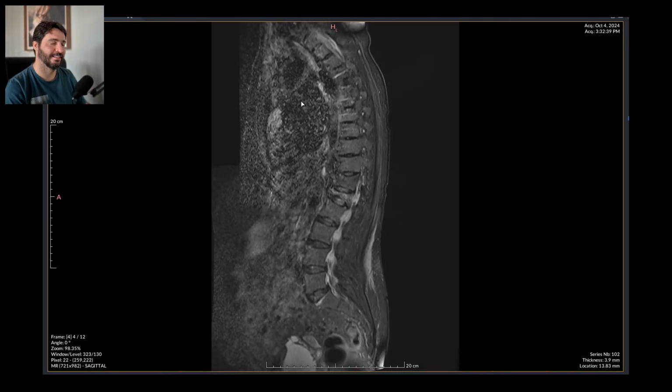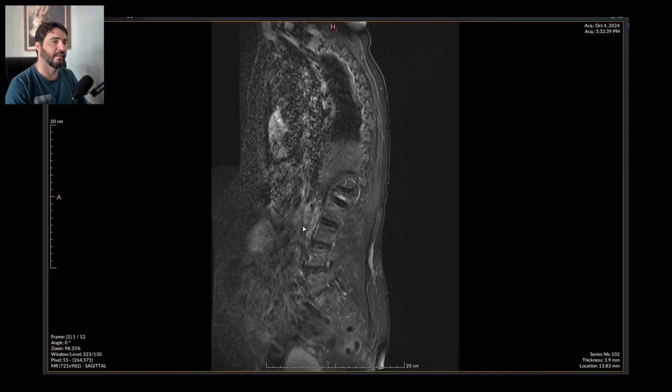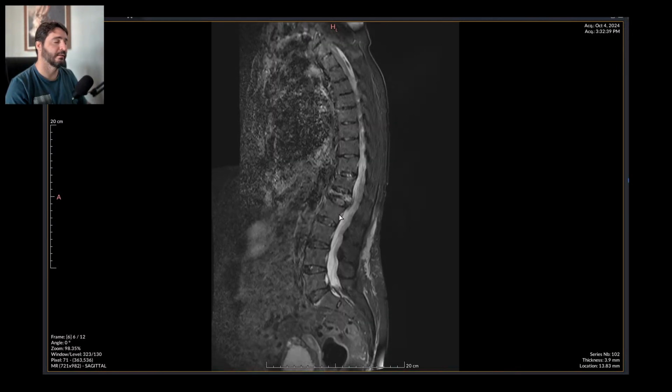This is just stupid. Come on. This can't be serious. I'm just going to give it up because there is no axial, and the sagittal is clearly half done, so I can't report this exam like this. It's impossible. It's a waste of time. I don't have time to waste, nor do you guys, I suppose.